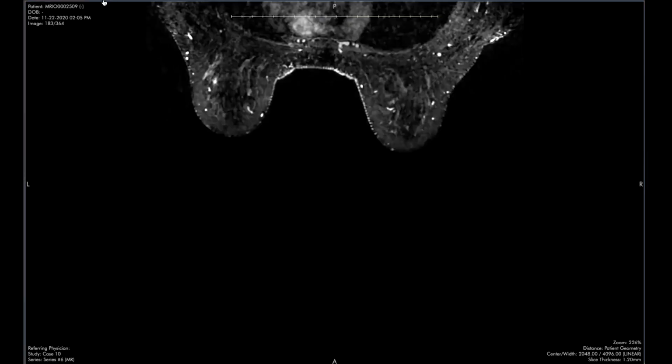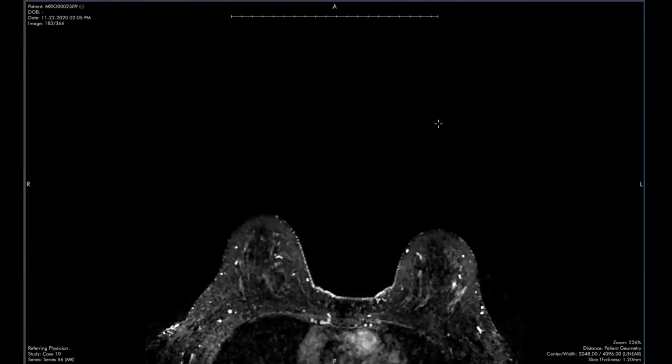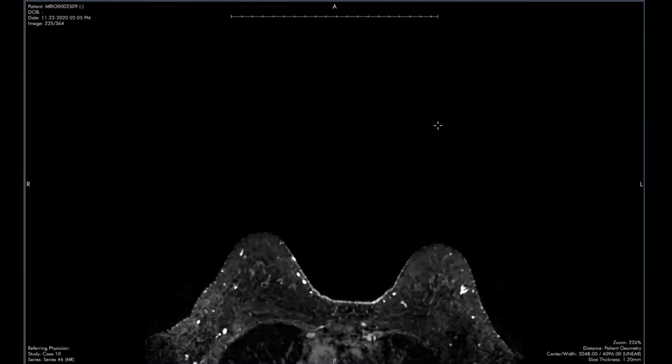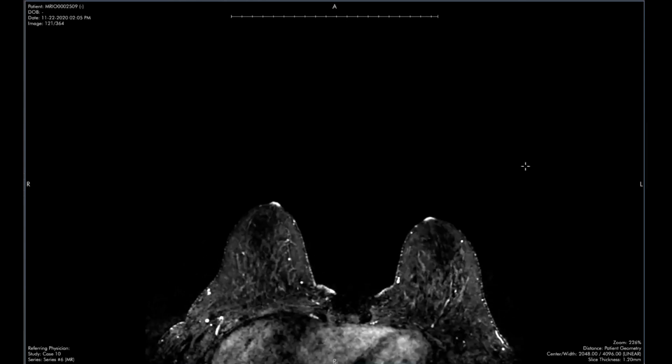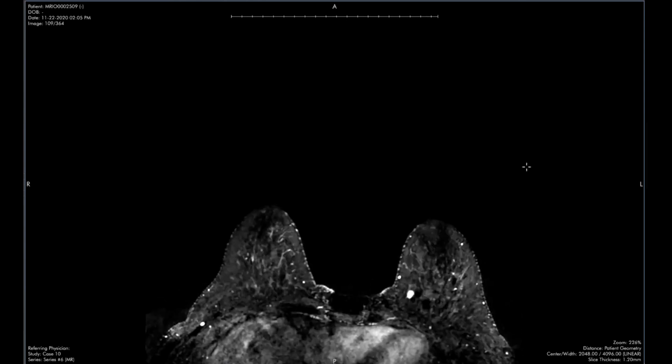We like to use the subtraction view to look at breast imaging findings. So here is our first run subtraction. We typically do 3 post-contrast runs in order to calculate kinetics. This is the first of those post-contrast images, and it's subtracted from the pre-contrast image. So the only things that are bright on the subtraction view are because there's contrast in them and they're enhancing.